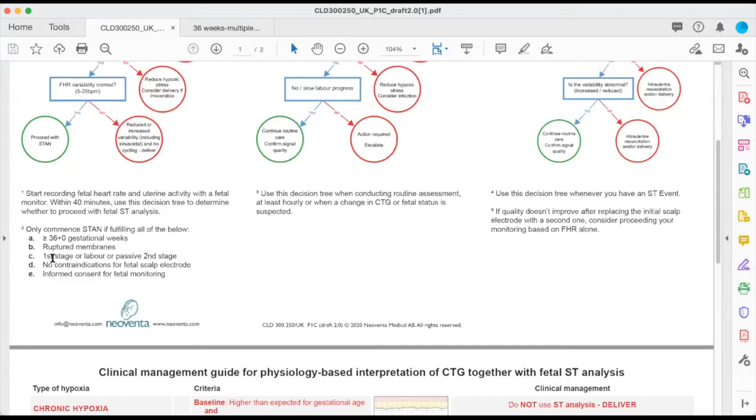Basically, you need to make sure that this baby has a stable baseline, maintaining variability, so it's not hypoxic in itself before you're starting. And it is stable, because even if the baby is very active, we also break down glycogen when we're active, yes? Because we need glucose to power up these movements. So you have to get it at a time when baby is more or less quiescent, not actively doing something.